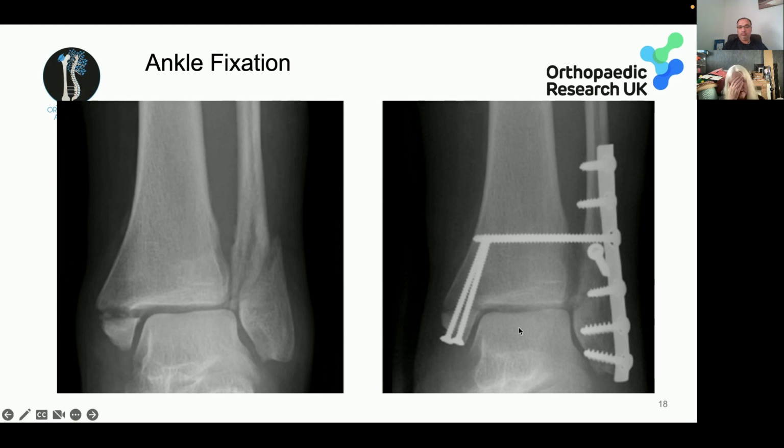So, you know, I've got a patient that is about 6 months after having fixation for a fracture very similar to this. He does a lot of hiking. And what he can feel is clicking and grinding. And that's probably because the screw's not broken yet. But it may be that holding these 2 bones together and then allowing your foot to do dorsiflexion and plantar flexion if you're climbing up and down hills might give you some restriction and some discomfort. So he's someone that we are going to remove the screw for. But it's usually on a case-by-case basis.